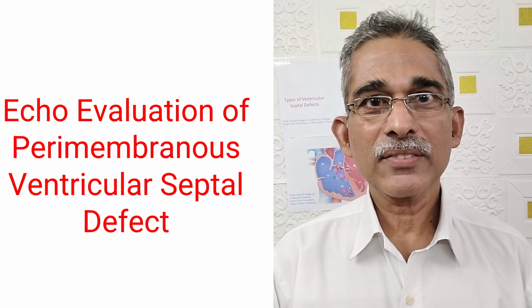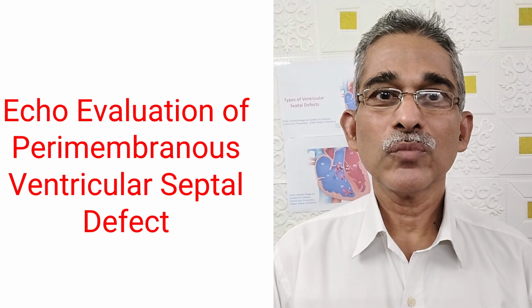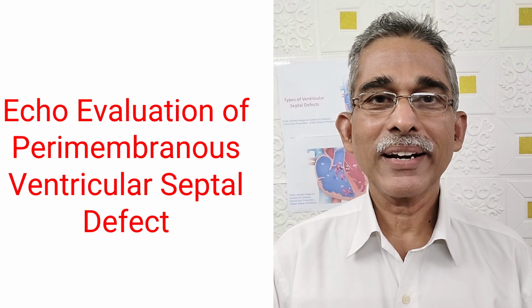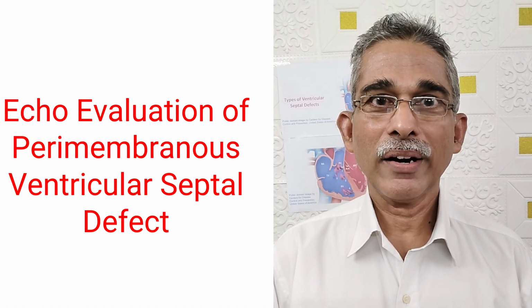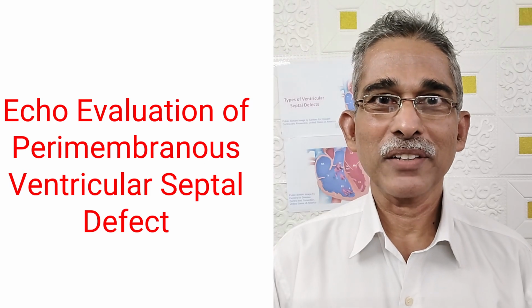Ventricular septal defect is the commonest form of congenital heart disease in children and adults. We will see which are the types of ventricular septal defect other than perimembranous ventricular septal defect before we go into the echocardiographic evaluation of perimembranous ventricular septal defect.